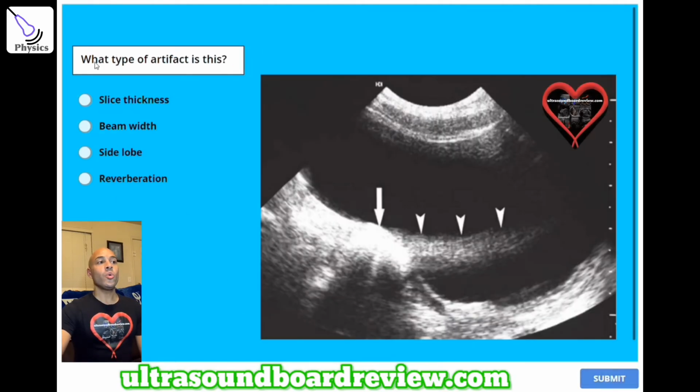Question number 13. What type of artifact is this? A. Slice thickness, B. Beam width, C. Side lobe, or D. Reverberation?